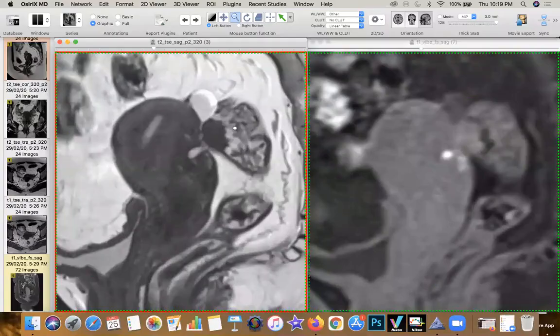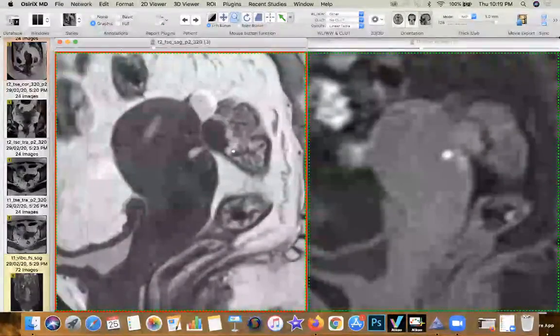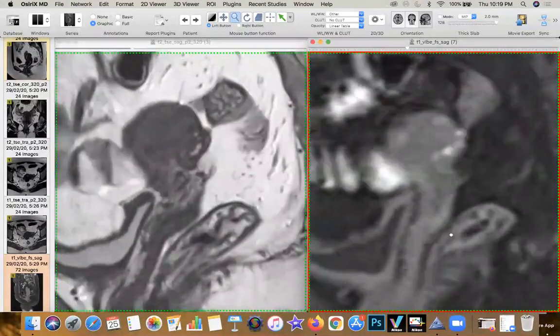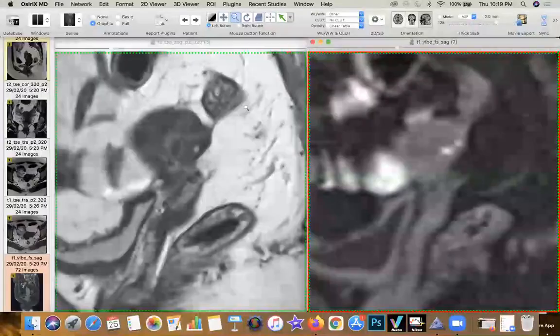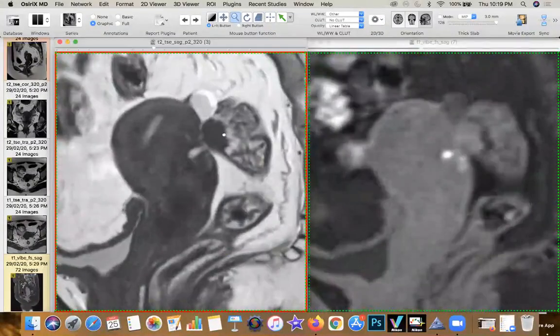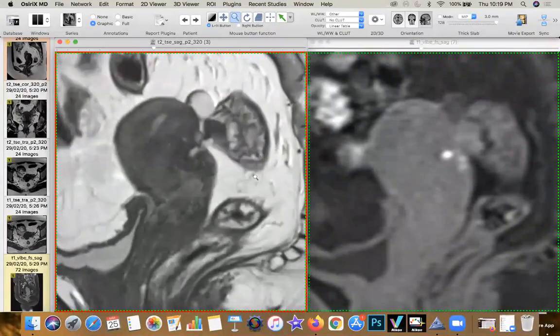Interestingly, what has happened is there is submucosal fat proliferation, not just edema. What you're seeing as bright is not bright, but you can see that on the T1 3D, the area has got completely suppressed. So you know the patient has had chronic inflammation involving the rectum. So you have the typical mushroom appearance with submucosal fat infiltration.